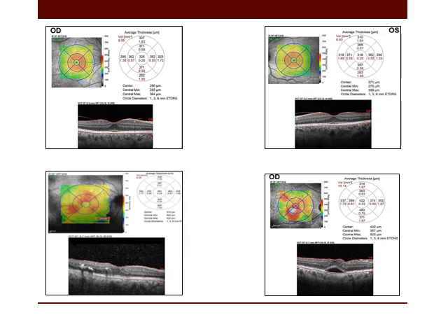Other instruments provide their measurement above the retinal pigment epithelium, so it will be lesser by about 50 micron, with foveal thickness of about 250, parafovea 300 and perifovea 250 again. So it is very important to know your database and the instrument you use.